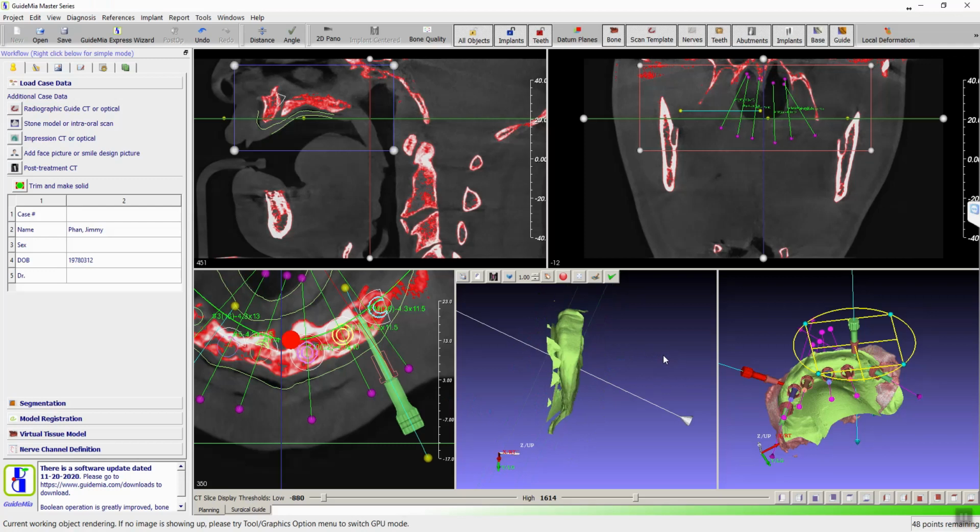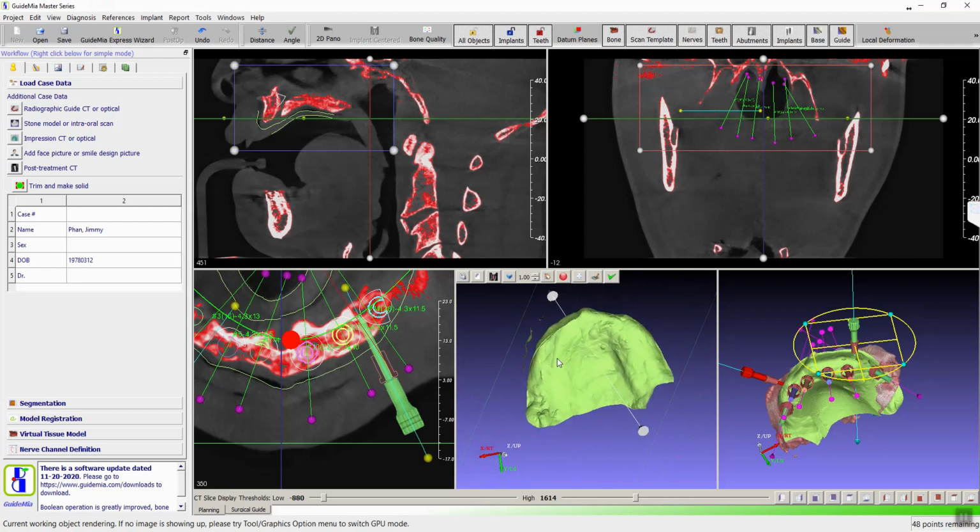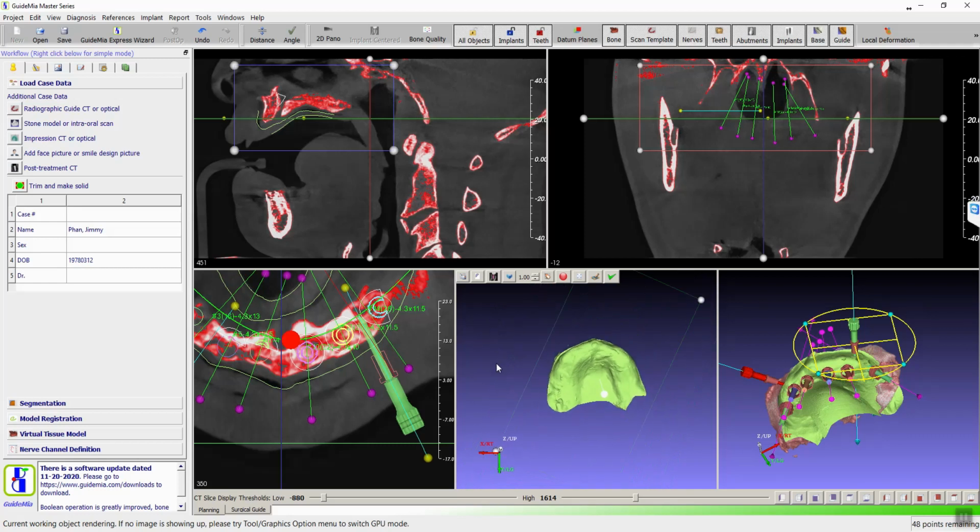Check the... So this is a tissue model, right? After this, I rotate my view so that I see the tissue side. I'll rotate this plane, so that's going to define the orientation of my model. I'm going to use the middle button to drag this. So we'll create a model to extrude the tissue side to this plane. So I'll finish this creation. Now you have this model.